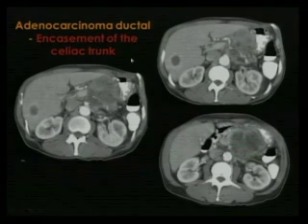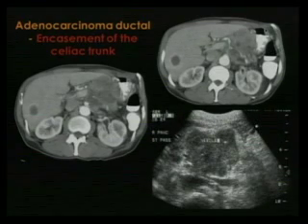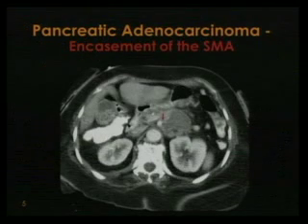Also, in this case, we have a focal lesion in the hepatic segment 6 compatible with metastatic disease. The biopsy was done under ultrasound for confirmation. This was a non-surgical candidate, obviously. Another situation, in this case, encasement of the SMA.